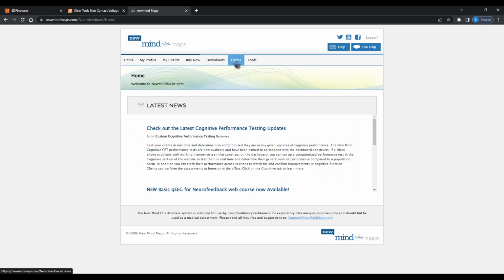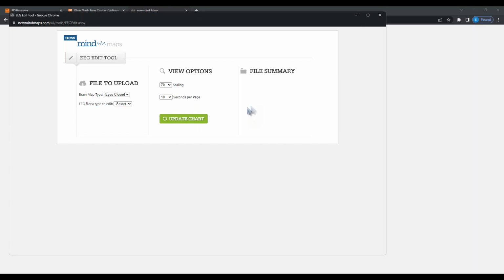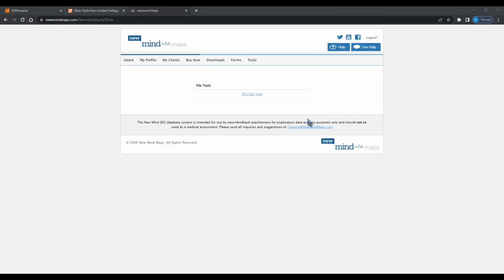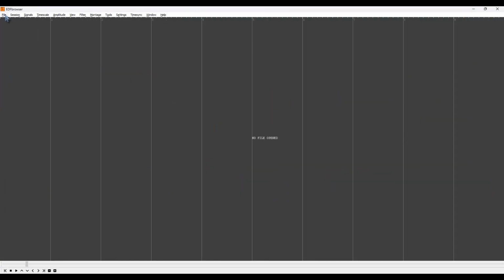If you were to put this next to the monitor that had the EEG in NewMind, do they look identical, or, because of the math and stuff, is it displayed differently? Yeah, the lines I can bring up.